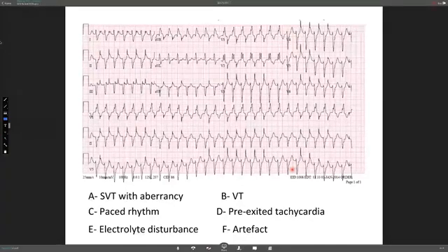My understanding is that some ECG machines would artificially put spikes on wider complexes, like on telemetry. If the patient has a pacemaker, we can make an option so that the device, the telemetry itself, artificially puts spikes, and that can confuse the techs and the nurses. So I'm not sure what would explain the spikes here. Yeah, exactly, I agree with you. I think it's probably a limitation of the ECG recording, and it's probably just an artifact, but I don't know of any other explanation.